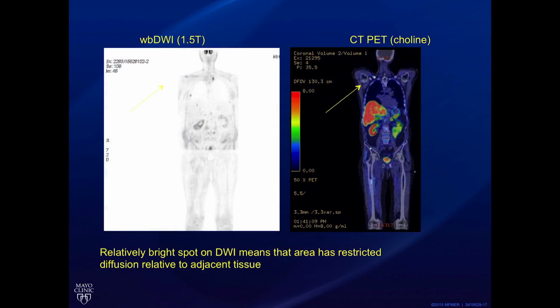And so here's some images, and again, at your institution, you have to have somebody that's a real proponent of developing this diffusion-weighted imaging. So we have a few people that are really pushing it, and they would like to see it just really compete with PET-CT, again, because of the radiation. And so here's the PET-CT, and here's the area of abnormality. This is a patient with metastatic disease. And this is the diffusion-weighted image. And so you see they're very similar.